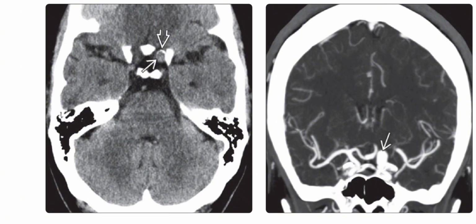Left image shows that some aneurysms exhibit mural calcification. This is a non-enhanced CT scan, and it shows an incidentally discovered saccular aneurysm, seen here as a well-demarcated rounded hyperdensity with a peripheral rim of calcification. Right image is a CT angiography image subsequently performed in the same patient. Coronal MIP shows a patent saccular aneurysm at the terminal bifurcation of the left ICA.